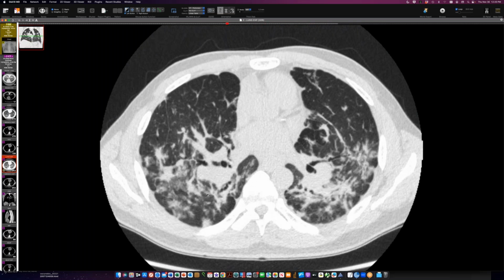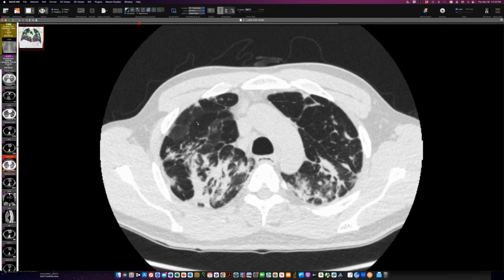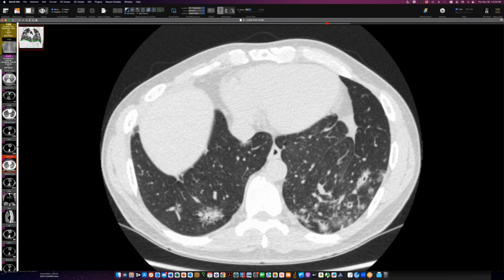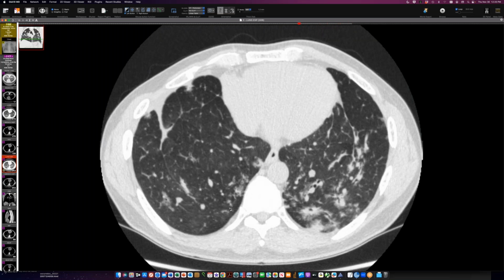Right. And you would expect also to see some upper lung nodules here. And the nodules in silica, as you're saying, are usually pretty discrete. I mean, they're fibrotic, so they really stand out. These are fuzzy and sort of cloud-like conglomerations here. And the stuff around the airway in the left lower lobe too is very shaggy. I would have called this sarcoid regardless and been done with it.